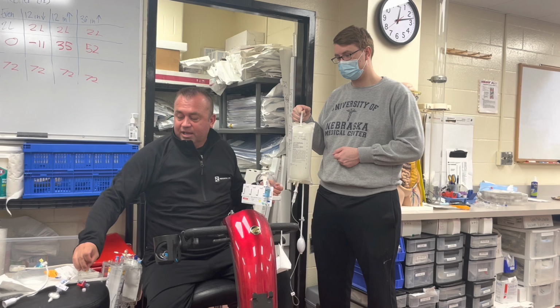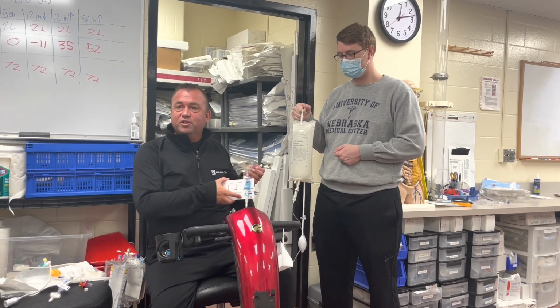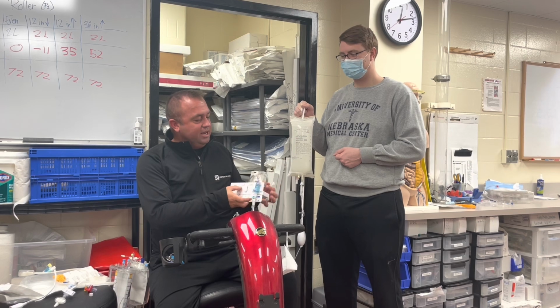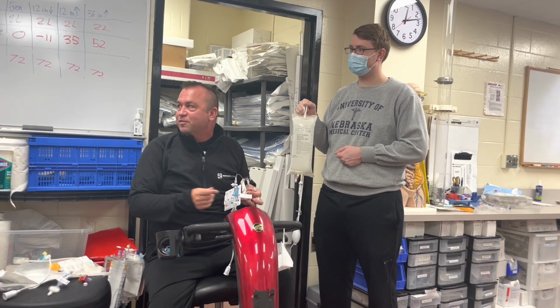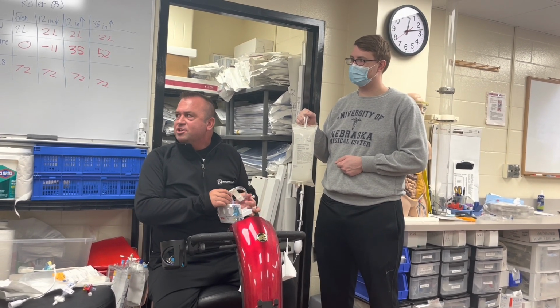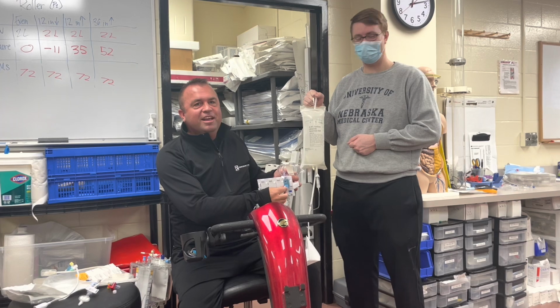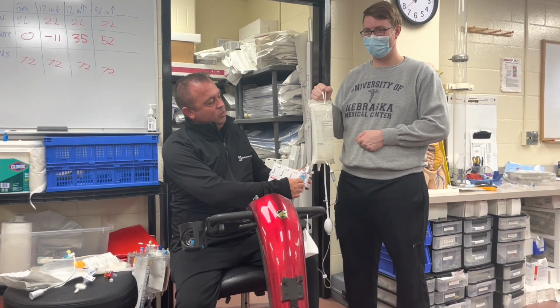Now, as our colleague over here, Scott Sanderson, might do when you're flushing one of these, if you have somebody that is really kind of an arch enemy and you're flushing your transducer, you can use this as a little bit of a squirt gun. Or if I was Scott's partner and Scott had really gotten me upset that day, I might just, while I'm flushing this, stick this in Scott's back pocket, maybe, and then pull or flush this a little while.